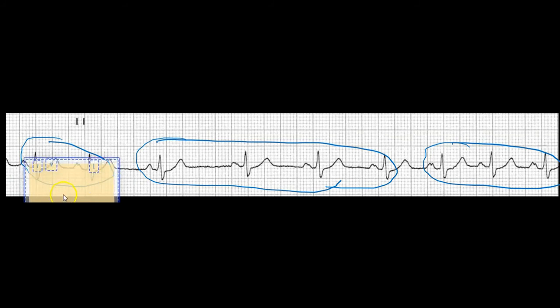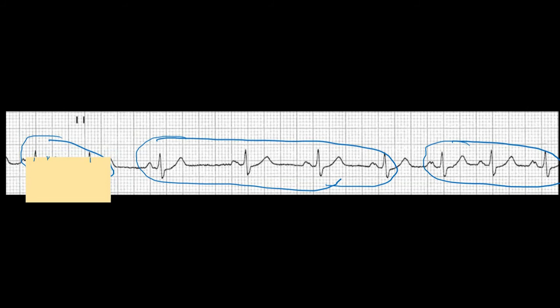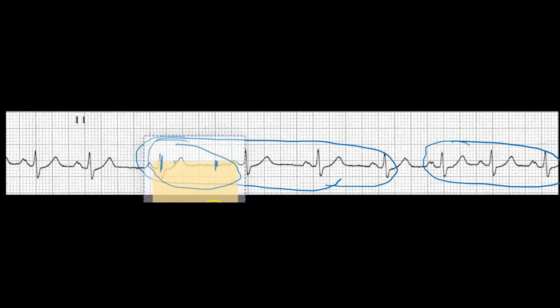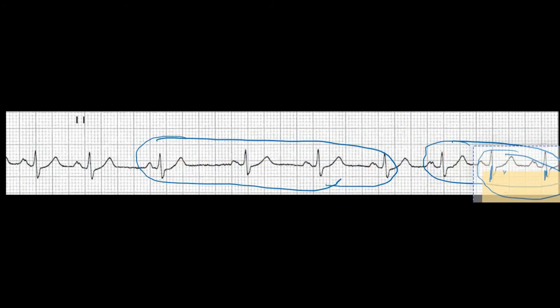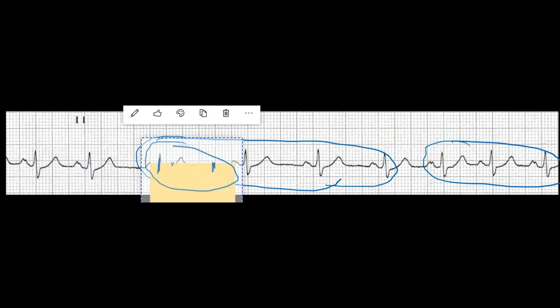Okay, and again, it doesn't matter where we are measuring things here for on our calipers, as long as they are consistent at the same wave all the time. Okay, so we're going to bring that down. We see that those are okay. And we'll bring down here. And almost looks like, yep, see how they fall back in line here? So these three are the same. And then we're going to see that these in here are going to probably be the same as well, but I need to make my paper a little bigger.